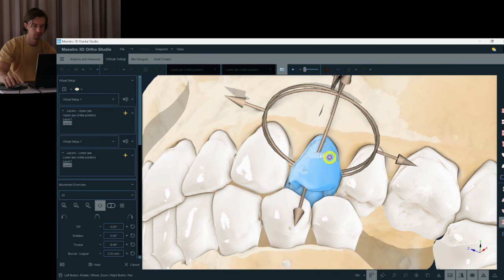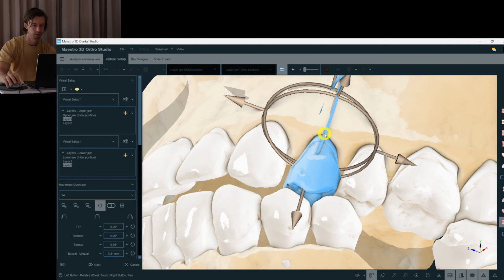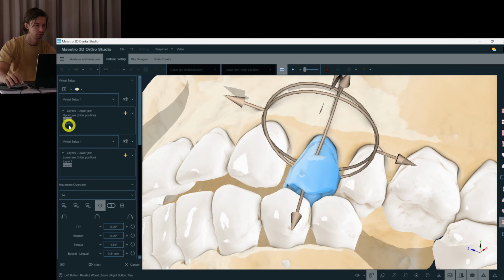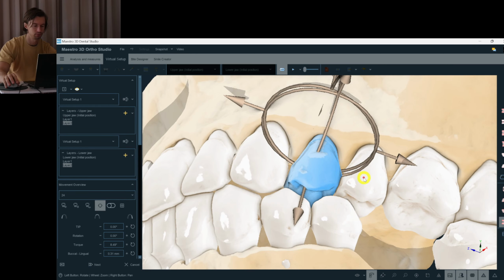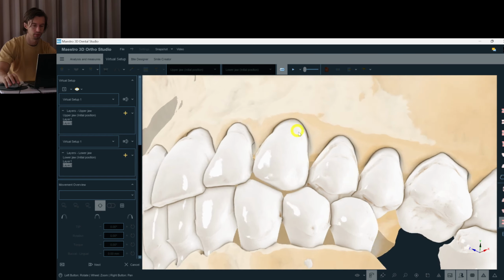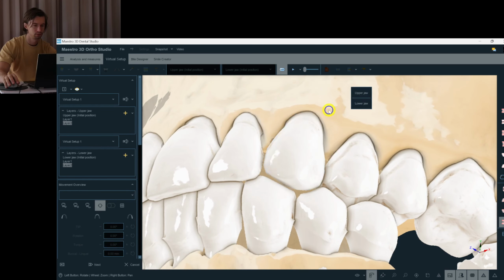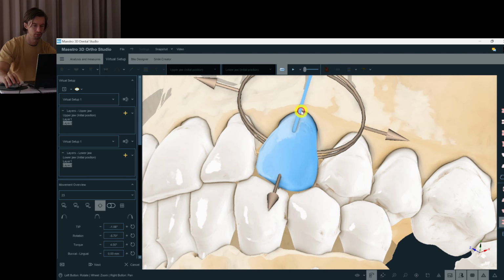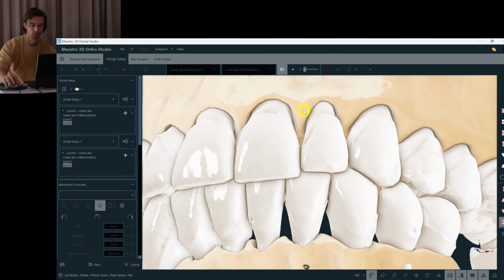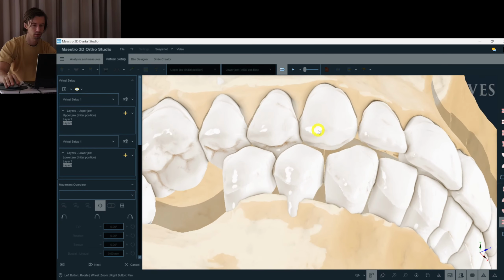I think I expanded too much here, so I can go to layer 1 to reduce this amount of expansion. So if I did, I go to layer 2 and reset the position of these teeth so that they are being reset as they were at layer 1. Looks good on the left side, and what's on the right side?